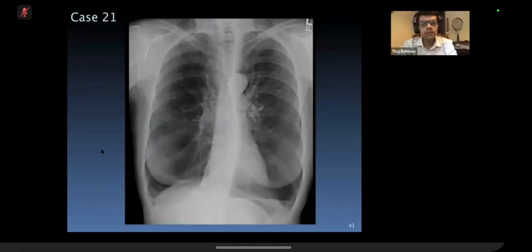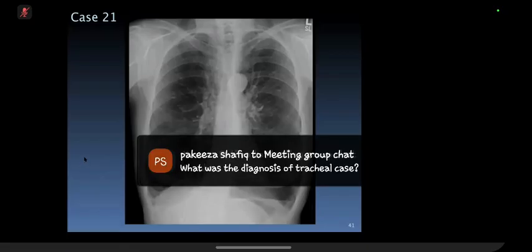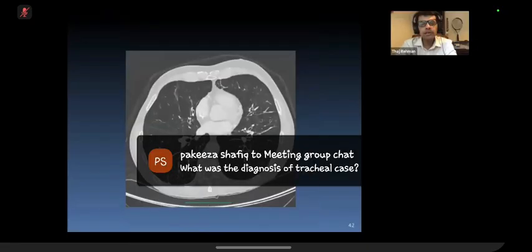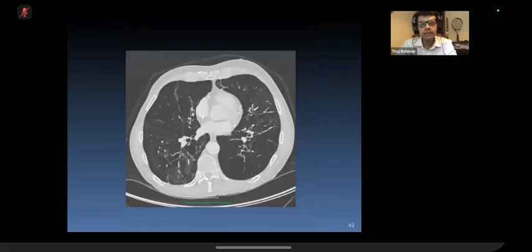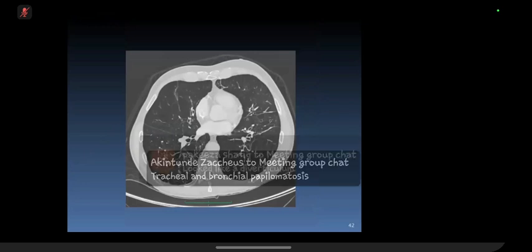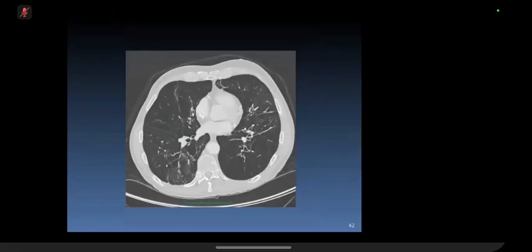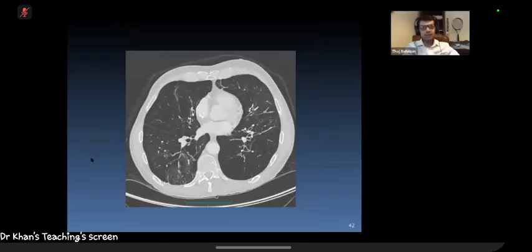Yeah. So how old is the patient? The patient is quite young. So what is it called? We'll give you CT. Let's see if that helps. Yeah. So there's florid destructive emphysematous changes in the lungs bilaterally, and I just can't remember the name of the condition. Alpha-1 antitrypsin deficiency. It is alpha-1 antitrypsin deficiency.